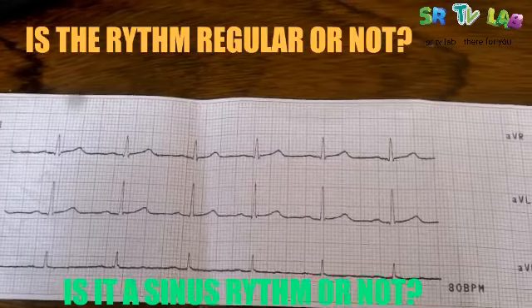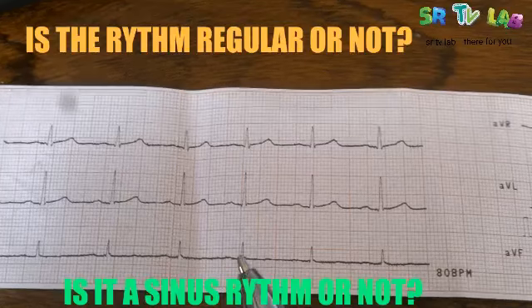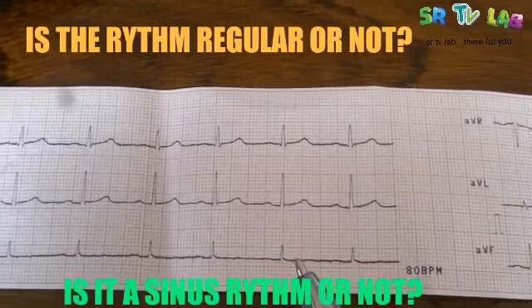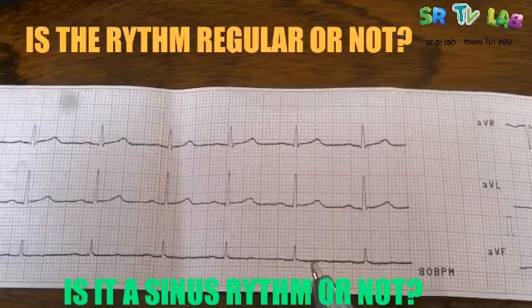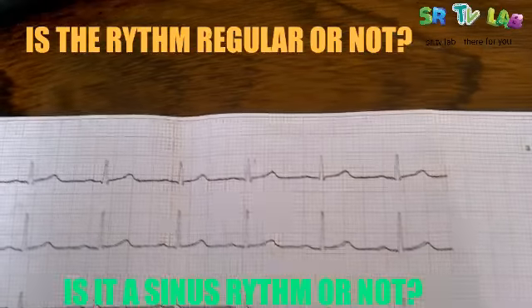So the next topic will be to calculate the heart rate just using the electrocardiogram. Also, we'll see the PR interval. Do you remember the PR interval?